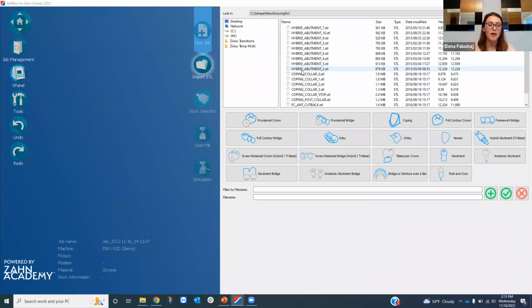But again, if you're auto archiving, scrolling through will be a breeze because you will only have so many left in there. This is definitely a great option for especially high volume customers, but even if you're doing a few units a day, it's just easier to navigate through what you need to do instead of what you already did and worrying about whether it's done or not.